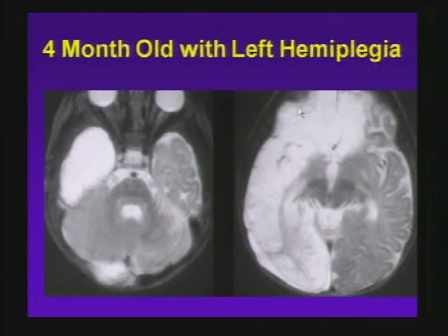Well, obviously there's a big stroke. You can see there's a whole hemisphere that's turned CSF signal. And there are lots of causes of pediatric stroke, hypercoagulable syndromes, what have you, but any clues, look further, anything else you see? I'm stalling a bit here. What about that? A fluid level, a hematocrit effect. Any thoughts what this could be? This is a subdural hematoma.